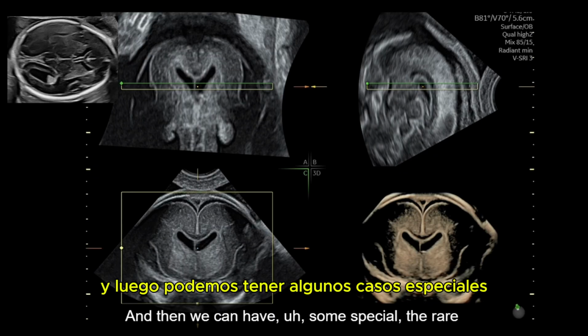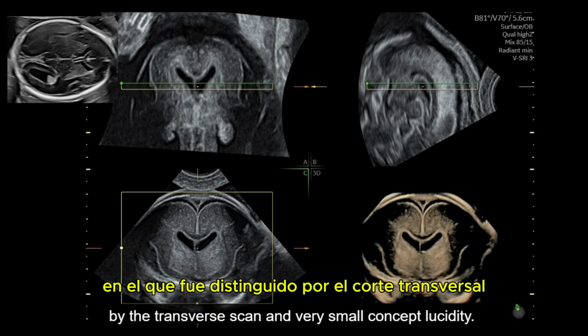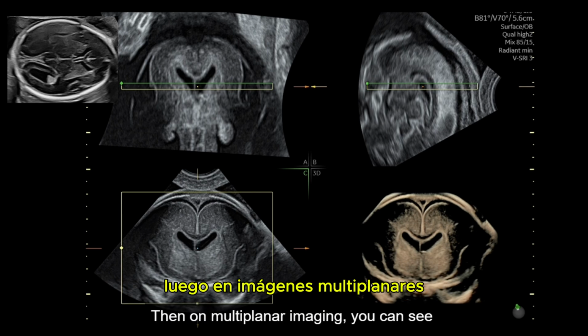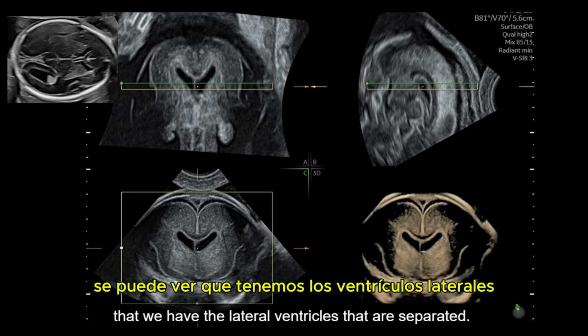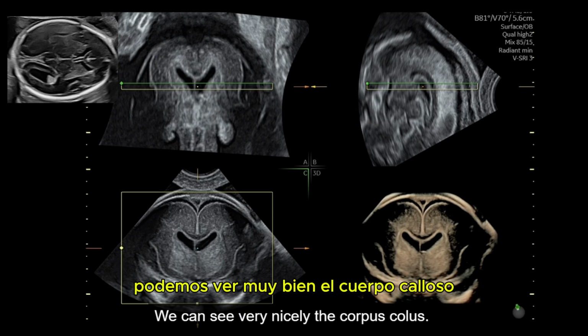And then we can have some very rare and special cases like this, which was depicted by the transverse scan, with a very small cavum septi pellucidi. Then on multiplanar imaging, you can see that we have the lateral ventricles that are separated. We can see very nicely the corpus callosum.